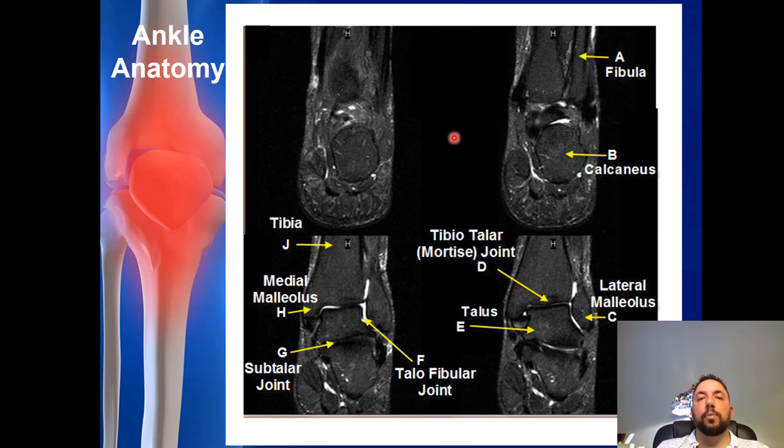In a few minutes when we look at the angulations for the coronal oblique and the angle, it's most important that you're able to present to the radiologist an image or two that gives all of the joints within 1 to 2 slices so that they can assess as to whether or not there's any pathology.